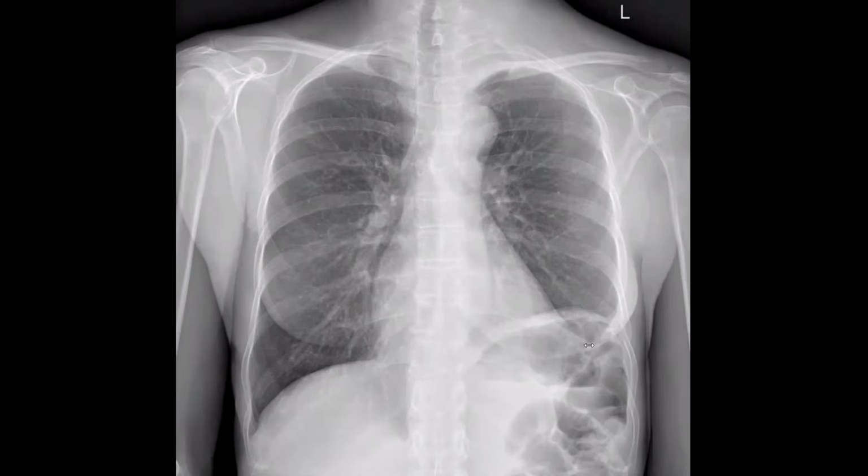Okay, let me check. Which one is abnormal? I think the left side was correct at the start. The left side, yes. There is a soft tissue shadow seen on the left at the base of the neck. You are right. This is the lung apex on the right side. This one is clear, but here we have clear opacification of the left lung apex, and this one is very clear now.